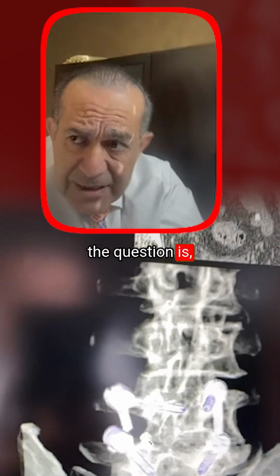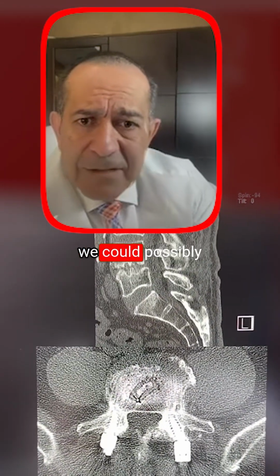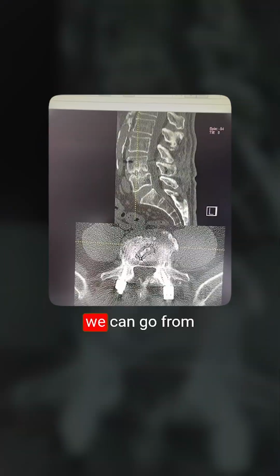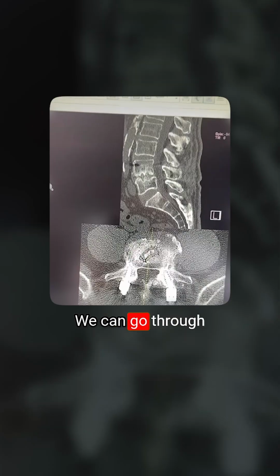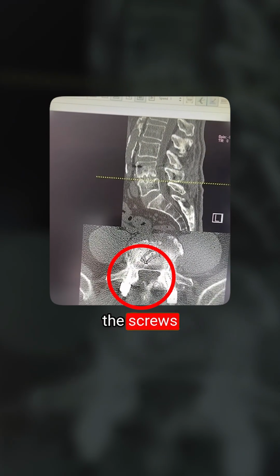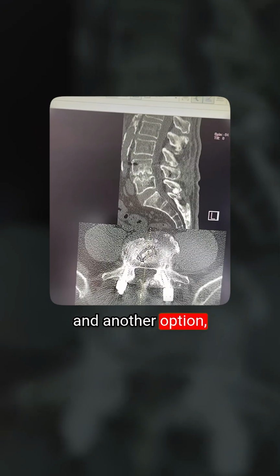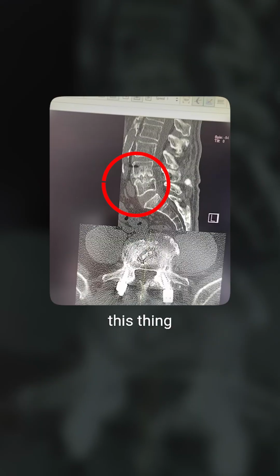Now the question is, what are we going to do? Depending on how much pain the patient is having, we could possibly leave it alone if the patient can tolerate the situation and if there's not too much pain. Alternatively, we can go from the front of the spine, because the operation was performed from the back. We can go through the abdomen, try to put bone graft here and remove these screws. Or we can go from the back of the spine, remove the screws, put more bone graft, and another option is to put bigger screws, put more bone graft, and try to get this thing fused again.